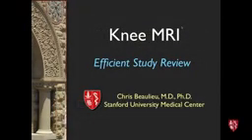When we look at clinical MRI scans, there's a bunch of different ways to look at the different sequences and anatomy. I thought what I'd do this morning is go over the approach that I've used for many years because I think it's pretty efficient. It's not necessarily the best system, and you can develop your own. But like with any radiologic study, you want to develop a systematic search that's thorough so you don't miss things, and also you want to be efficient.